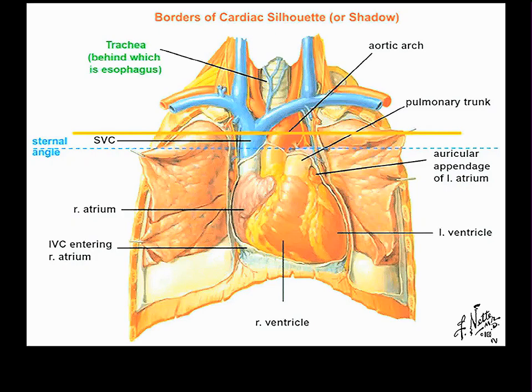All right. I'm going to start out with a section that is not through the middle mediastinum. I'm going to start out with a section which is in fact through the superior mediastinum, through the lower, inferior part of it, because it goes through the aortic arch. It's the simplest section you can get in the CT of the chest. It has the fewest things in it, and is the easiest one to start identifying things in.